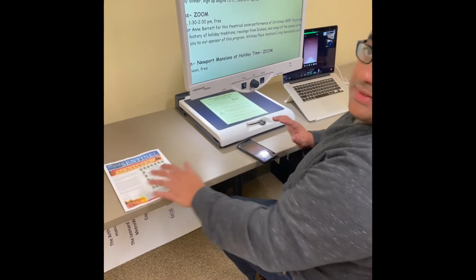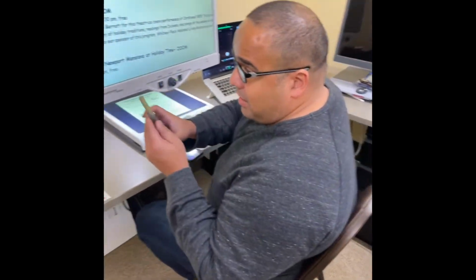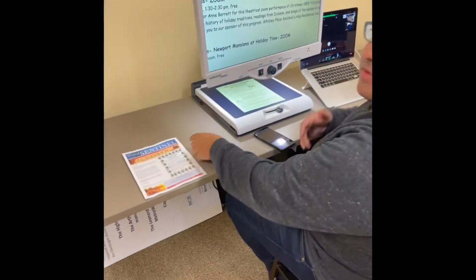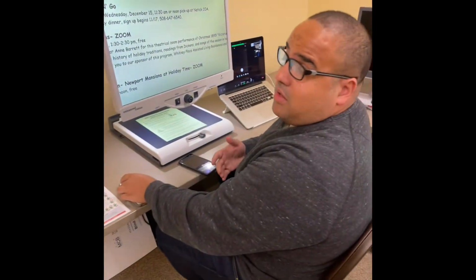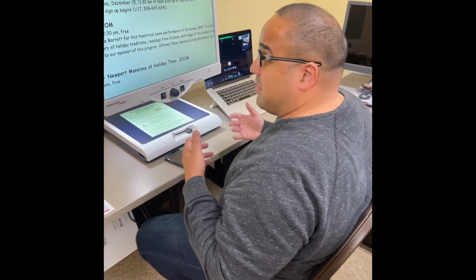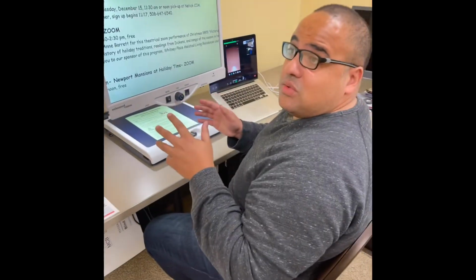Some best practices for using the app are either putting your hand over the phone to cover it and then placing it down to finish listening to it, because otherwise it could start the process of recognizing information again. So for example, this is the way not to use the app.